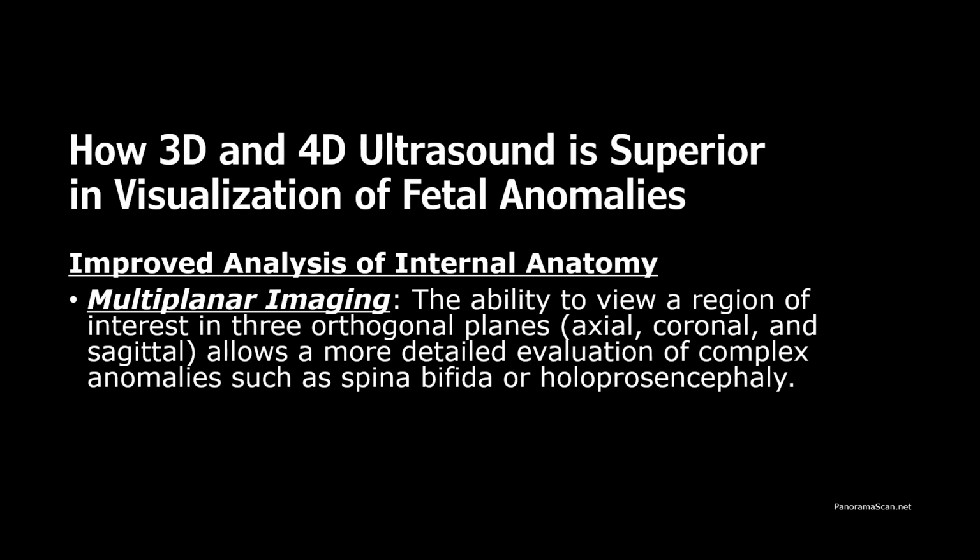This technique allows us to view a region of interest in three orthogonal planes, axial, coronal, and sagittal planes, which provides a more detailed evaluation of complex anomalies such as spina bifida or holoprosencephaly. By examining these multiple planes, clinicians gain a deeper understanding of the anomaly's full extent and its relationship to surrounding structures.